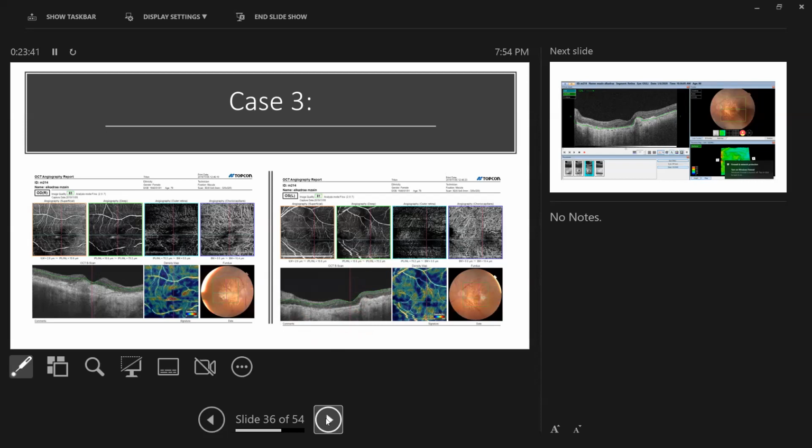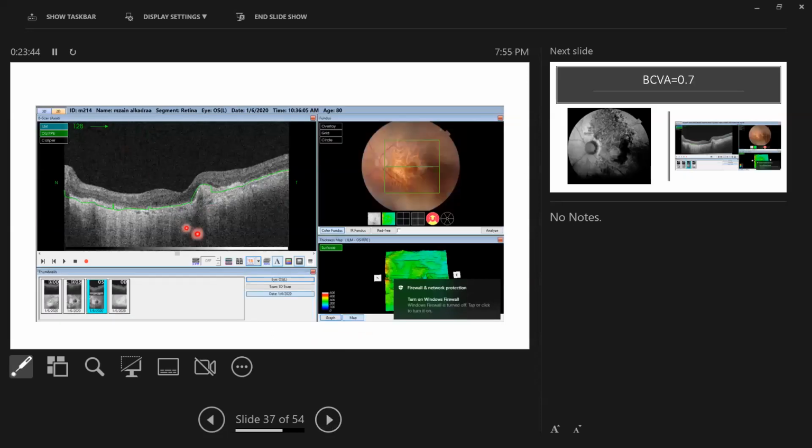I sent the patient to do the vision test, and surprisingly, if you look here, can you identify the photoreceptors? This, by the way, is the green line, marking the retinal pigment epithelium. Okay, so what do you think now? Can you guess what's the vision in this patient? Just a guess. Yeah, poor vision. What can you guess? Just a guess. 6/60. Okay. What else? Could be counting fingers. Yeah, more logical.